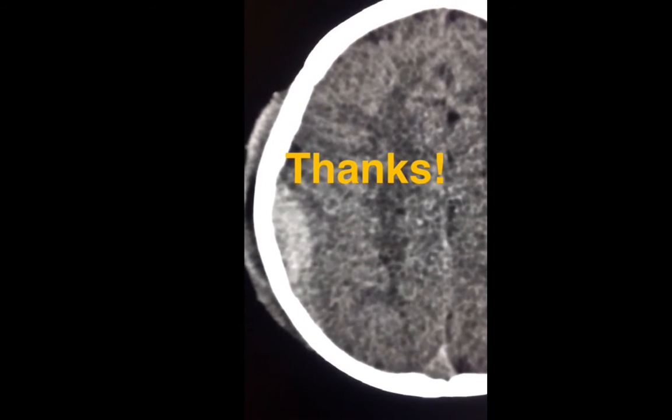So this was a quick case about traumatic brain injury with a non-displaced fracture and underlying epidural hematoma.